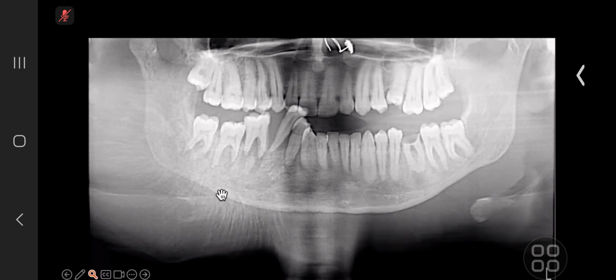Can you see this periosteal reaction? Oh yes, the soft tissue. Yes. So there's a big soft tissue swelling also there. So what is that periosteal reaction called? What is your next step of investigation? What will you do to this patient?